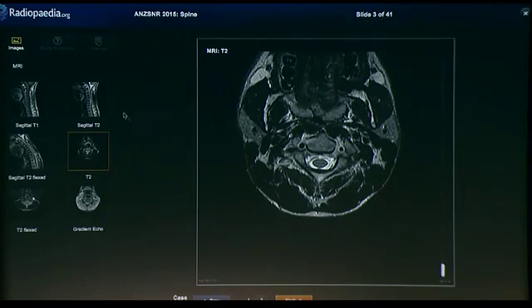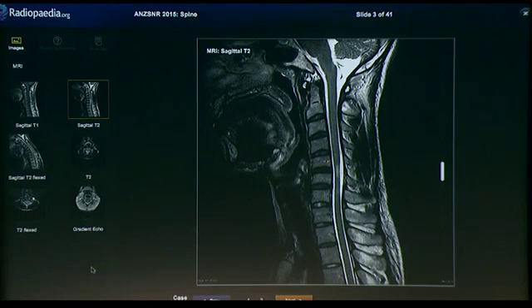So clues to the diagnosis here. First of all, there's the clinical picture, bilateral upper limb motor changes, and this location of abnormality. You might start thinking chronic myelomalacia from, say, previous MS, but really the location distribution is pretty unusual for that. Previous compressive myelopathy you could think about, but there's no evidence that this person has had significant disc disease in the past or any intervention.